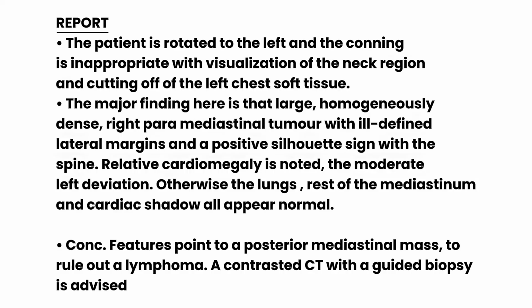There may be a lot of radiological features there. There may be other normal findings, but in order not to bore the referring doctor, you want to start with something that is of significance. And here it's always good to open your sentence by saying the major finding here is the large, homogeneous, dense right paramediastinal tumor, like I was showing you, with ill-defined lateral margins and a positive silhouette with the spine.